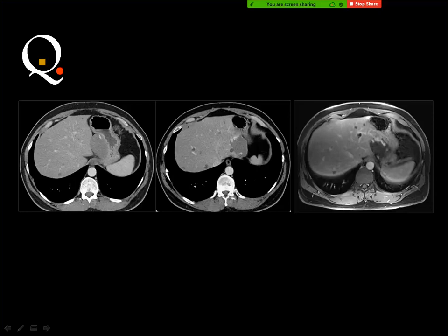Diffusion signal. You do not judge the wall of the stomach if it is not fully distended, and this stomach is not fully distended. Multiple hepatic cystic lesions. Yes, these are benign cysts. Is there any other lesion?